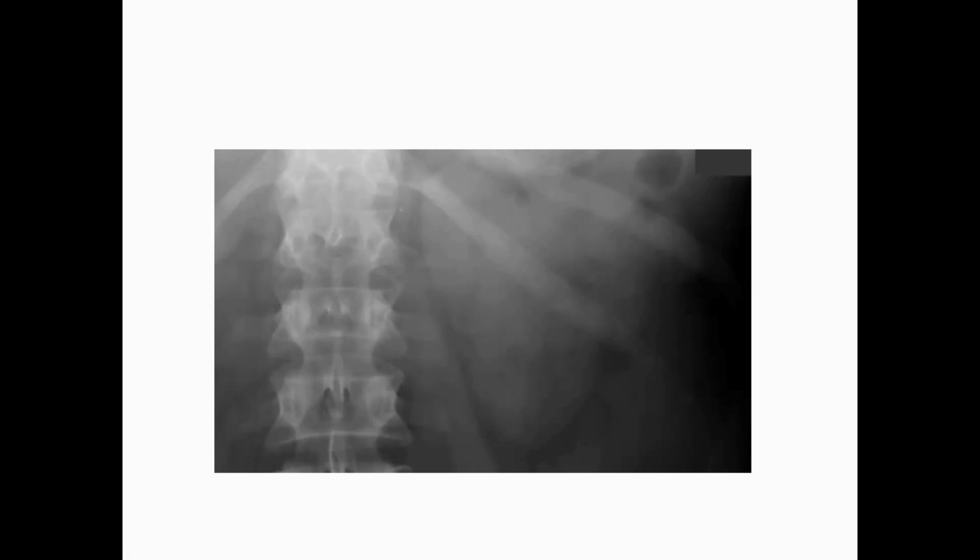So, the kidneys usually lie at the level of thoracic vertebra 12 until L3. So this is T12, 1, 2, 3. So this is lumbar vertebra 3. So actually the kidney lies between T12 and L3. Okay. And the left kidney is usually higher than the right one due to the position of the liver. Okay, so now we have looked at the soft tissue of the kidney.